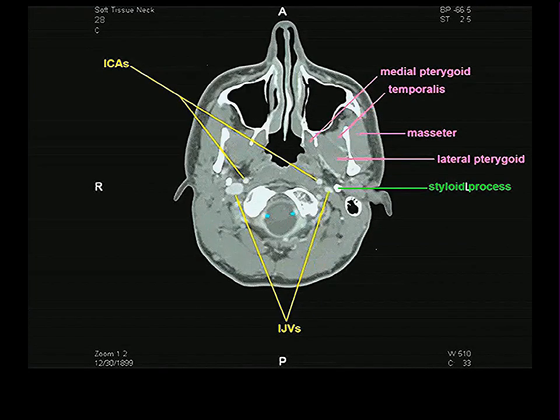Again, here is our internal jugular vein. Here's the internal jugular vein on the left side, very different sizes. This is quite typical. Very different sizes. This is a question for whether anybody read clinical sidelights. What would be the size of this internal jugular vein if the person was sitting or standing? The same? It'd be almost empty. It'd be almost empty. Someone has read clinical sidelights.